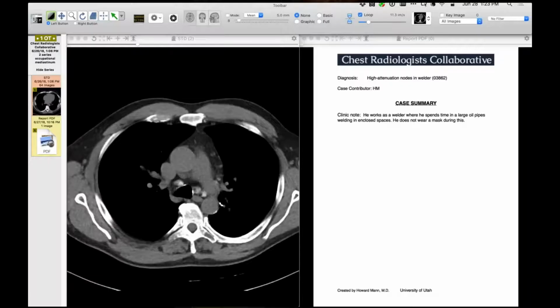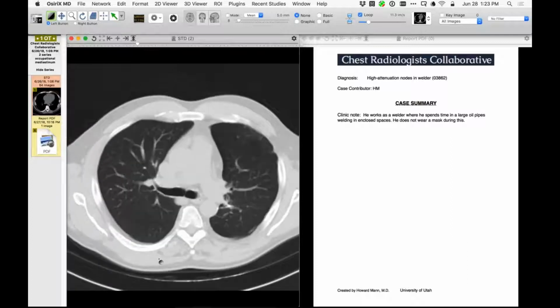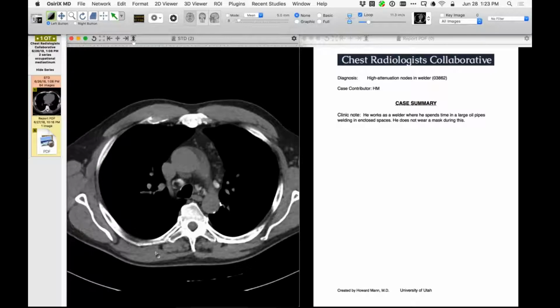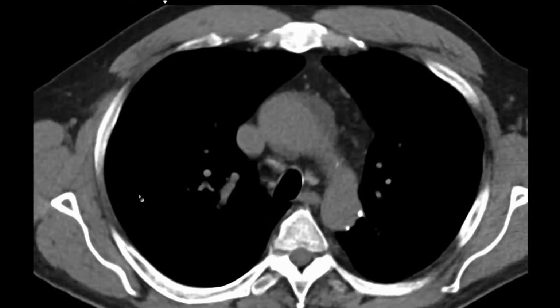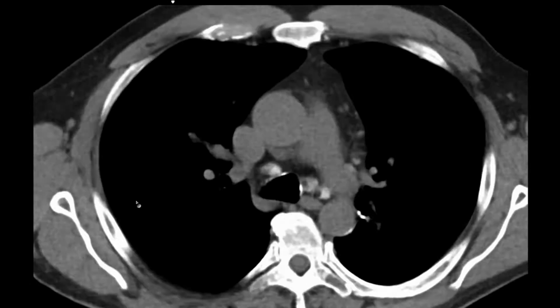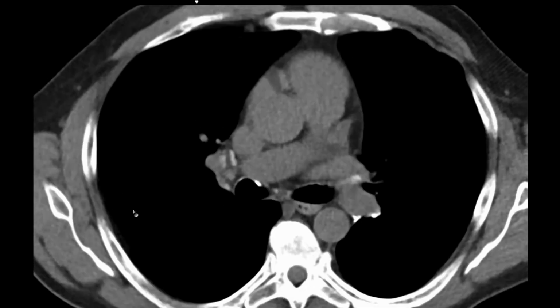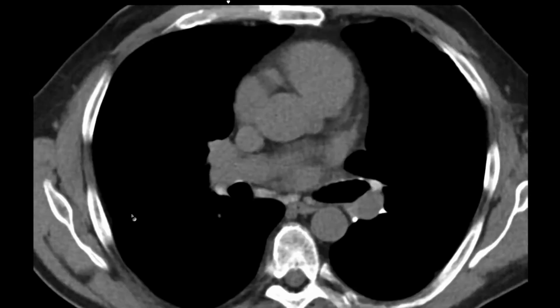So that's important, I think, when you're looking at cases of perilymphatic nodules and you may not have the history if you're trying to distinguish from sarcoid, because with sarcoid you tend to get the central sort of icing sugar look to it early on, and then as it progressively calcifies, you get more of the chunkier calcification. Once you have eggshell, it's a little more challenging. But you can imagine with your pattern there, if it continued on, you could get some thicker calcification. And sometimes those lymph nodes have milk of calcium centrally and denser calcium in the periphery.